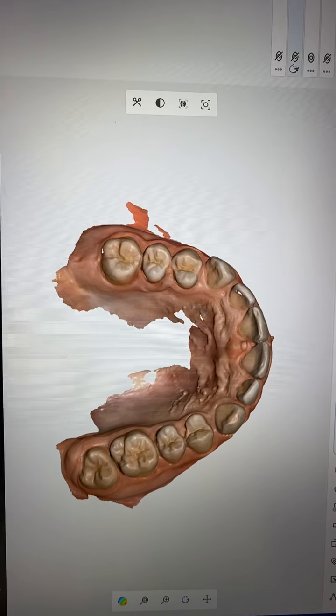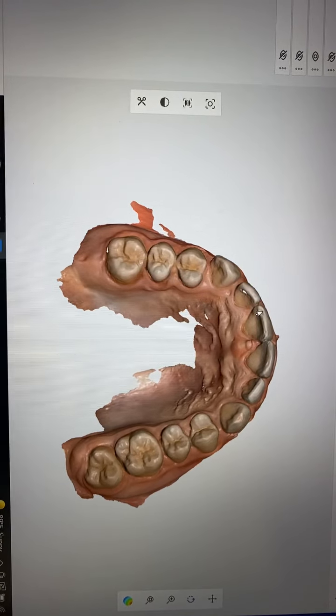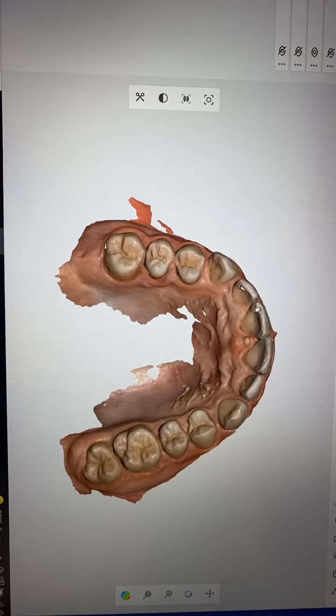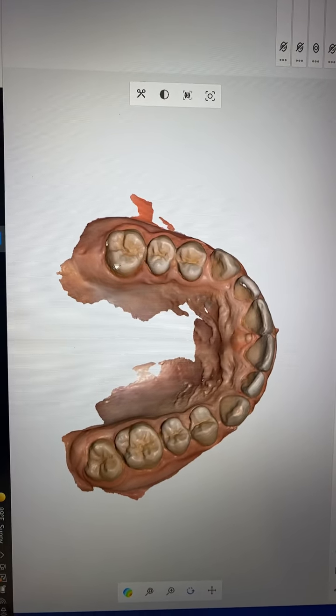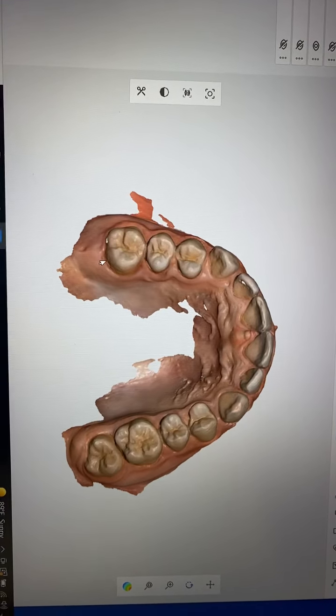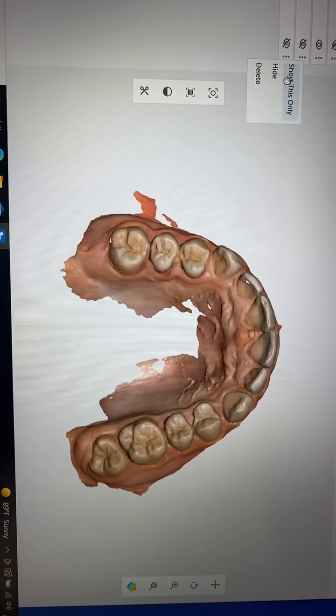This is the other issue I explained to the dad: at 16 and a half, typically you should see the second molar coming in like this, but because it's not very active, the second molar is still in there. That's one way to educate a patient about exercise and everything.